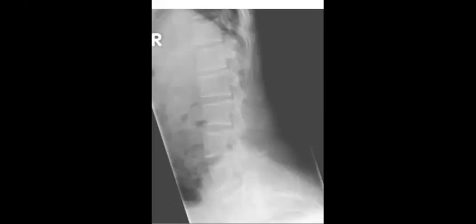We mentioned the criteria already. The pedicles are truncated or narrowed, the spinal canal is narrowed here. And there is no destruction in the bone, so no tumor. The posterior body scalloping. Also horizontal sacrum, perfect. The pedicle we mentioned is shortened. So achondroplasia will be the best for this case.